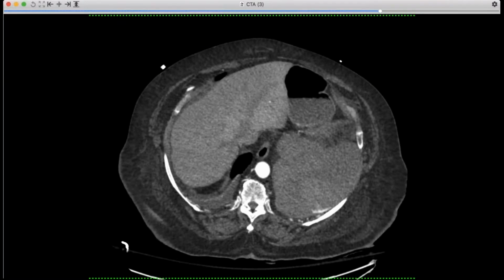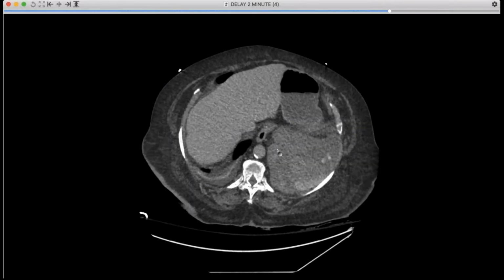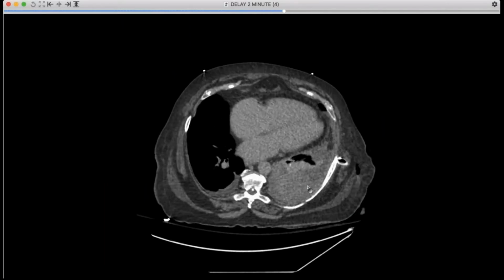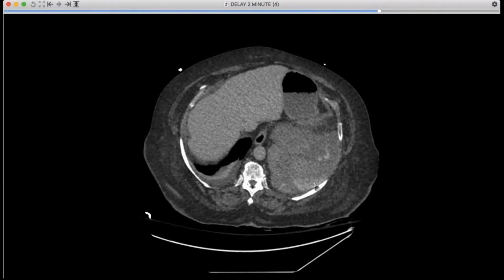And the resident who was on call that evening had requested some delayed images, which you can see, there's the blood pooling down in the pleural space. So we have a hemothorax that developed following a tube removal with clear intercostal artery hemorrhage.